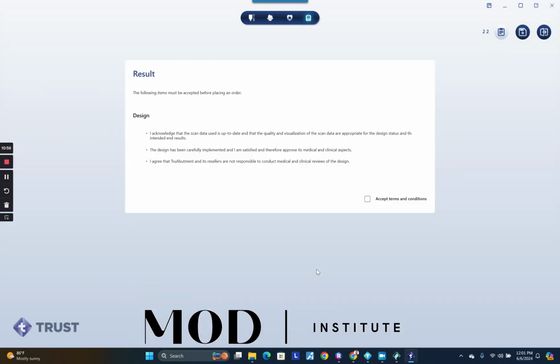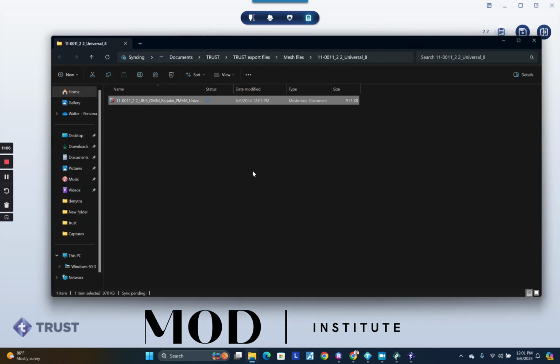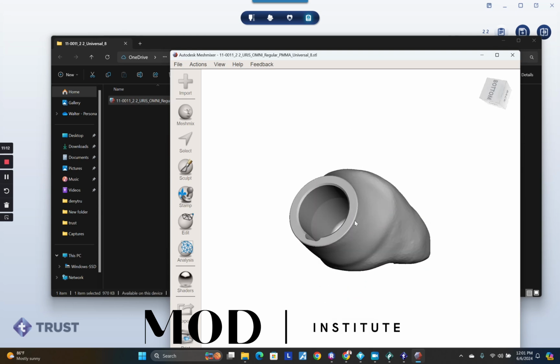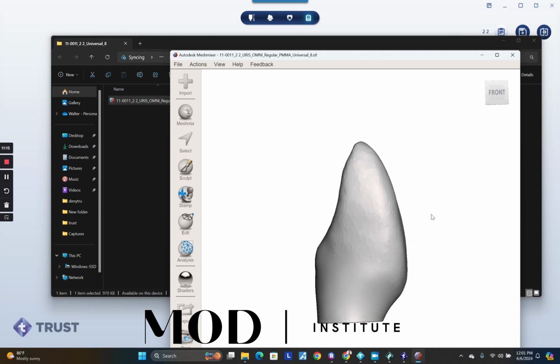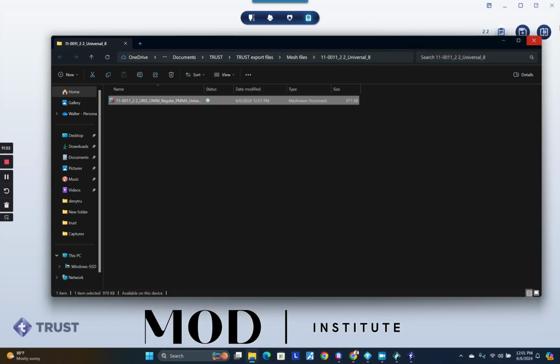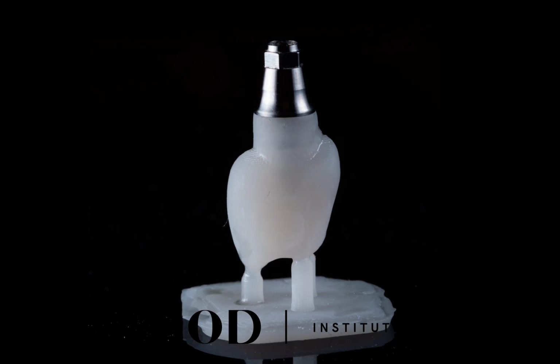And that is basically it. We're finished and we could export these files. I mean, guys, this is so cool. Export these files and look at what we have. We have a tie base crown for free from software pre-surgically that we can now place that implant, do it timed, which if you guys don't know what timing is, it's the rotation of the hex based off of the surgical plan, and then screw in a prosthetic.